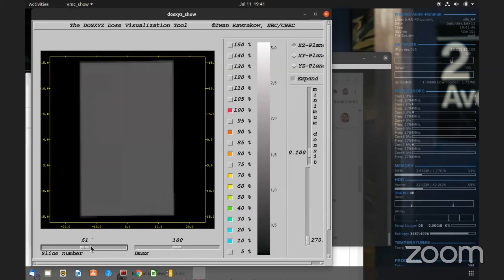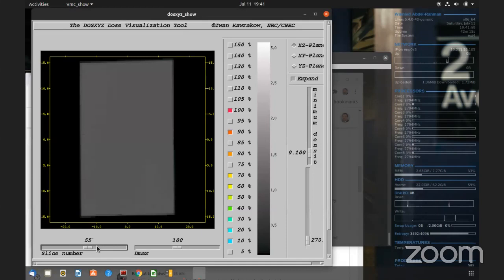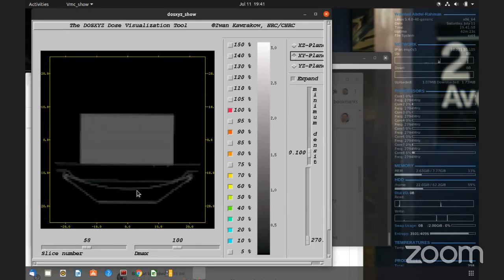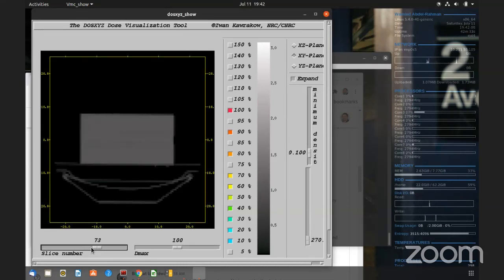This is a solid water phantom that we use for IMRT. We actually use it for TG119 commissioning. It's solid water, and let me show you a different plane. So you can see the couch. And we should have somewhere the opening for the chamber. Maybe because of my resolution with this phantom, I selected something. Yeah, there it is. So that is actually where my chamber goes.